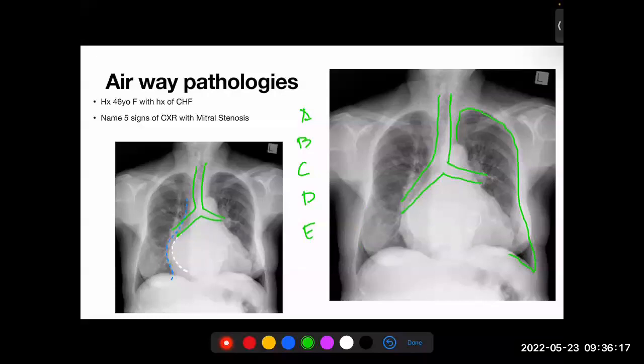But then look at the heart. If you look at the heart, let's start up here from the aortic knuckle. From the aortic knuckle, there should be a small depression there, which has disappeared. Then the heart is enlarged. You follow? Then the heart has 2 shadows. So double cardiac shadow is another X-ray finding in mitral stenosis. Splaying of the carina, double cardiac shadow.